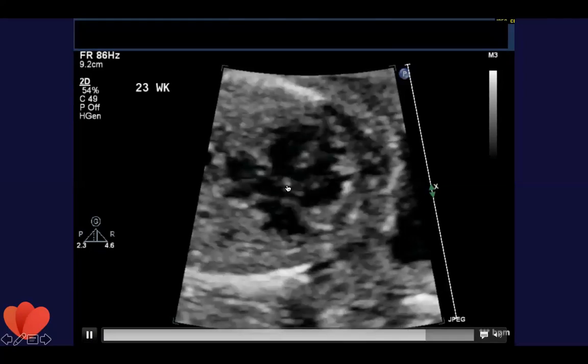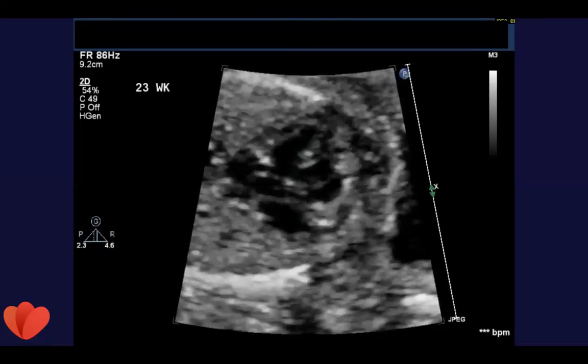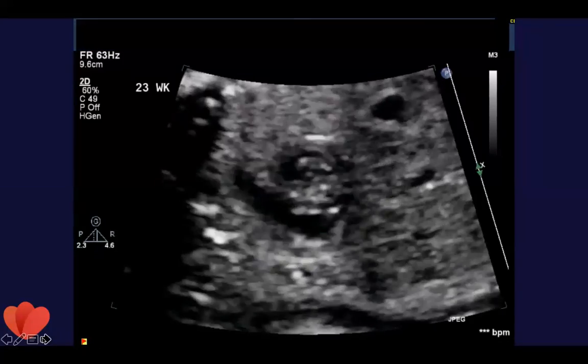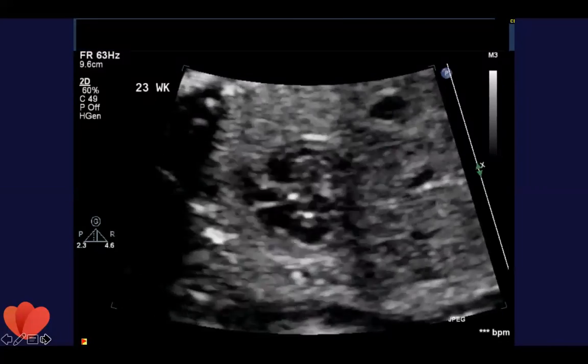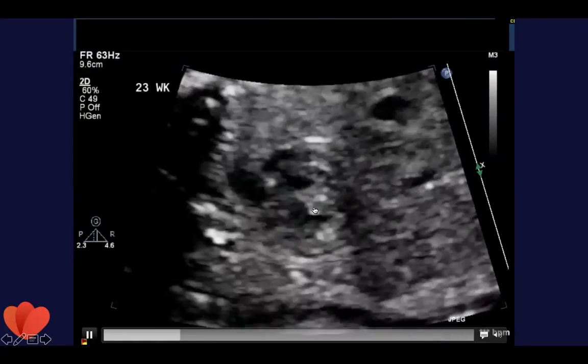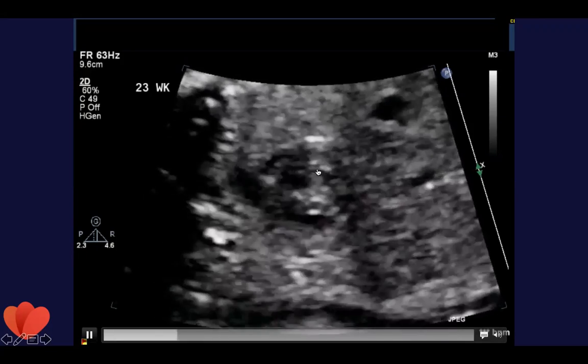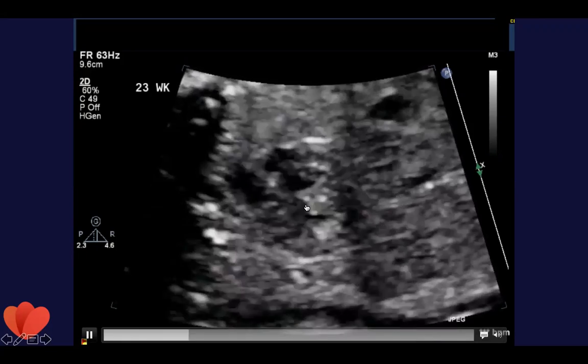There's really just one big valve that opens nicely into both ventricles. Also, when identifying atrioventricular septal defects, looking at the valve en face in the transverse plane is also very helpful. Here you can clearly see that it's one large valve instead of 2 separate valves.